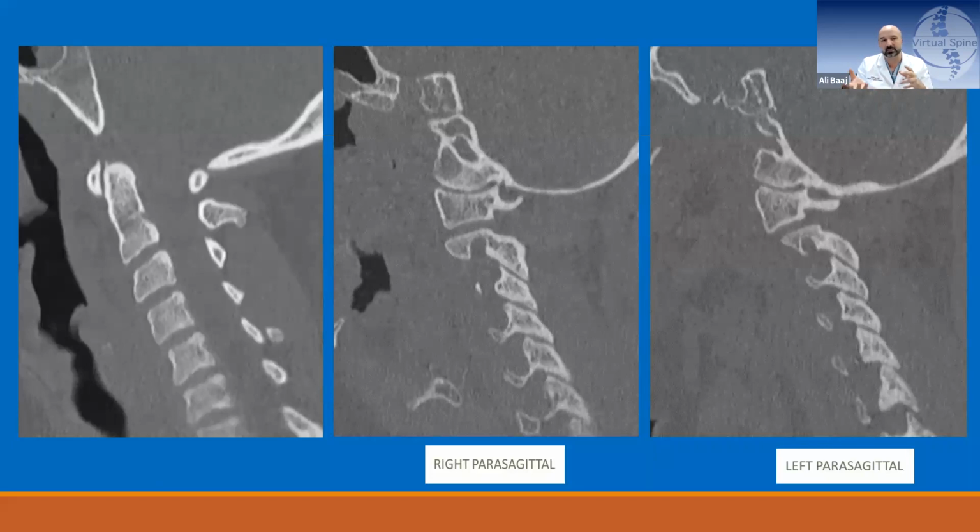A lot of us have seen this. When there's malalignment, and I really believe strongly in those capsular ligaments and how the condyles sit on the CT scan, if you want to be a little conservative and maybe the patient's in the hospital for a day or two, you can repeat the CT scan. But for me, alignment is just so much more important than the integrity of ligaments on imaging. That's just a personal bias. Yeah, perfect.